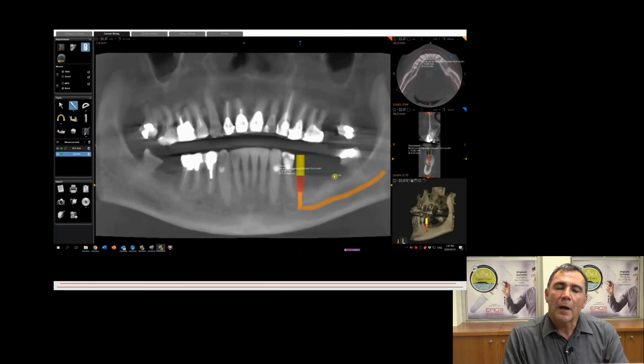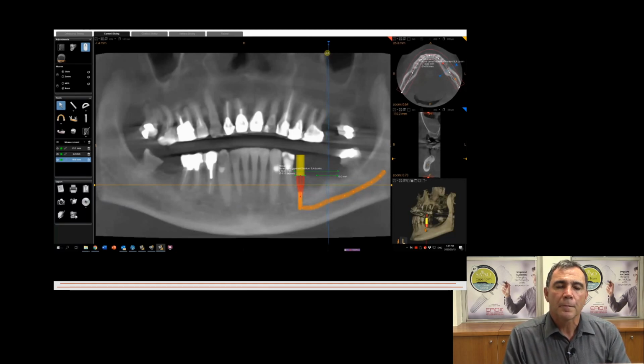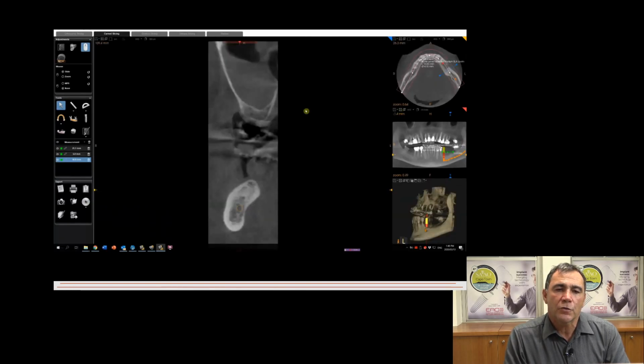So at the back I'm going to place one premolar implant in the anterior, another pontic in the middle of 5 millimeters, and in the distal of 10 millimeters I want to place a molar tooth. So there seems like there's a lot of bone on the panoramic view, but obviously we already saw right in the beginning that I'm going to have a huge problem here.